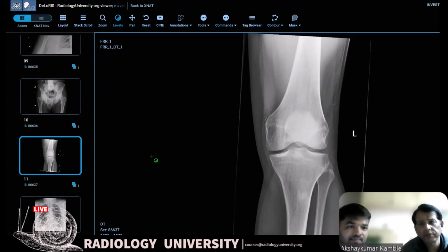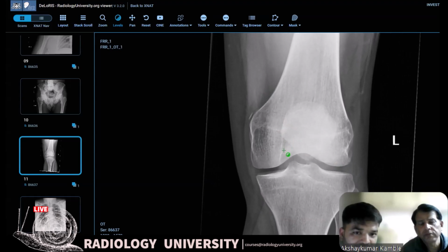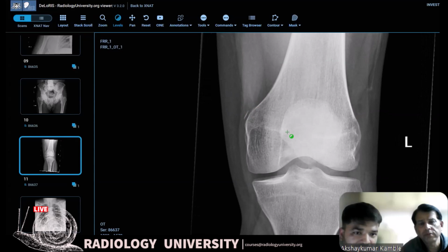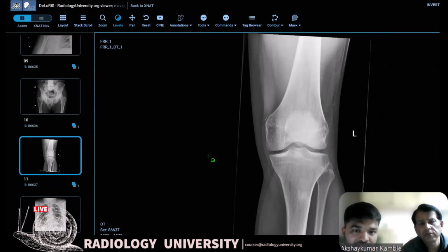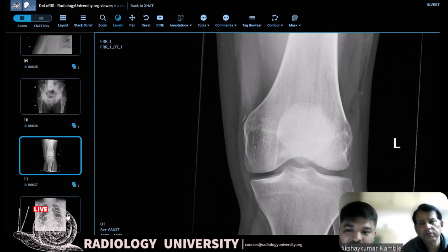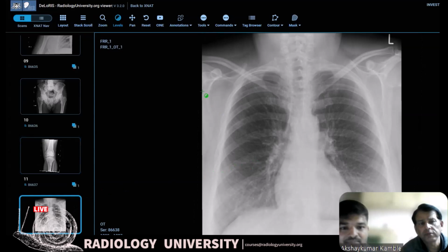Anyone wants to take it? The Pellegrini's lesion over the left distal femur. Good. Yeah. That was a subtle finding, so that's why it's important that you guys zoom in and look at everything if you're not finding anything obvious.